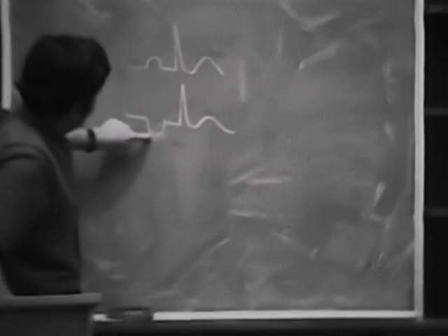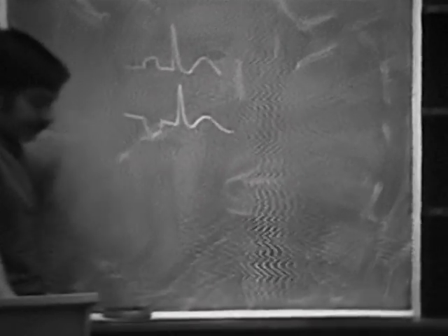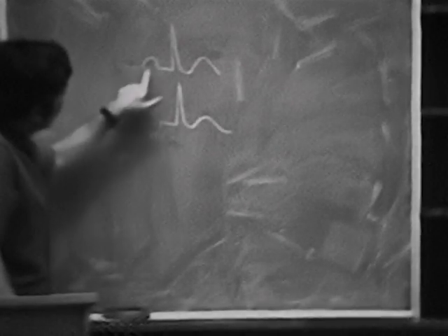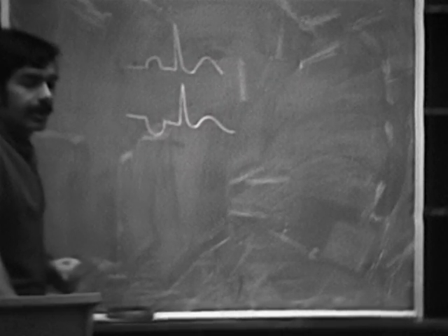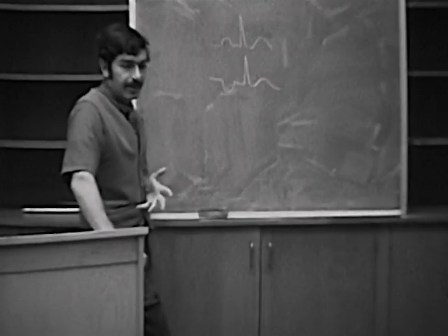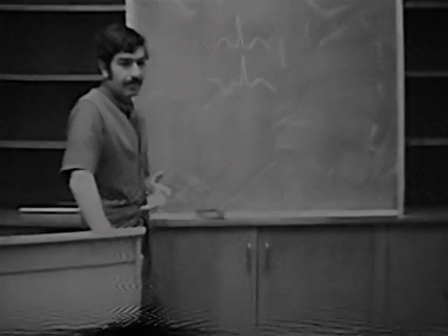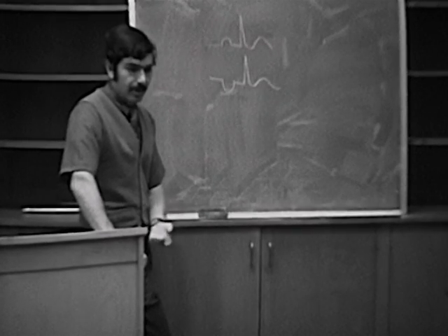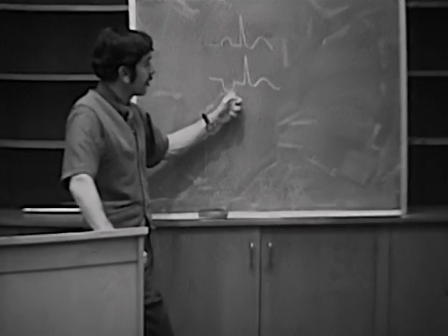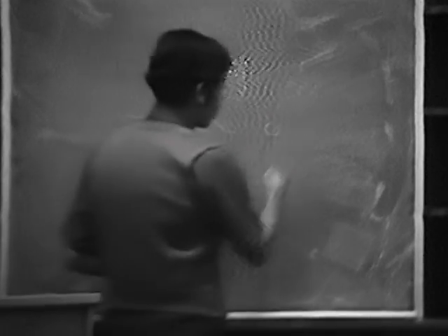Right, you have an inverted P wave, usually, let's say we're looking at leads 2, 3 and AVF, where the P waves are usually upright. So in the same leads here, now the P wave is inverted. So what are we dealing with? No, not necessarily. Could be an ectopic focus where? Where in the atrium? Low in the atrium, okay? Low atrial focus, we call that a coronary sinus rhythm, or a low atrial rhythm. A structure low in the atrium is the coronary sinus, so some people call this coronary sinus rhythm.